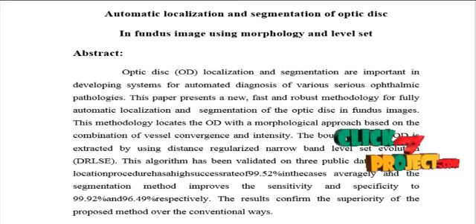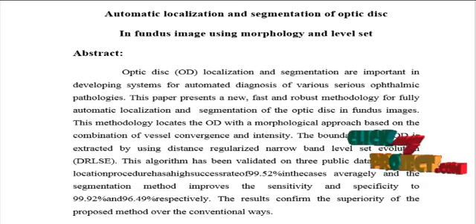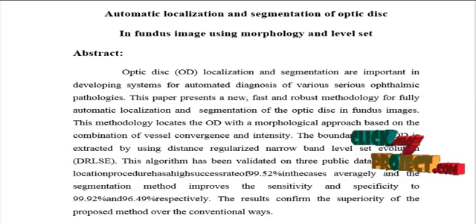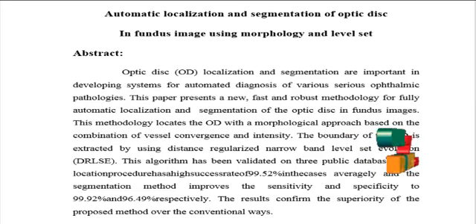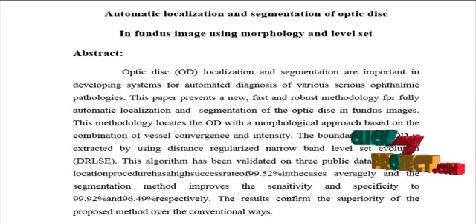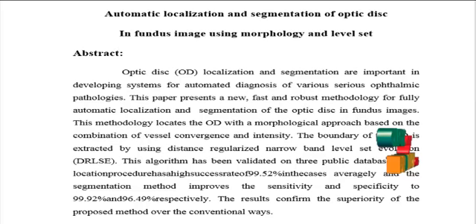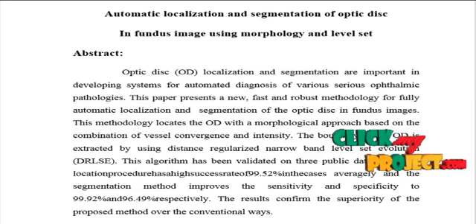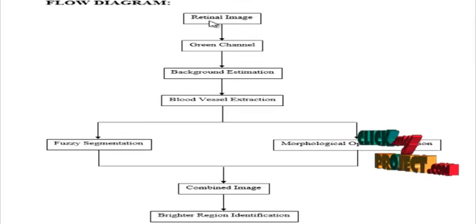Finally, the contours were extracted for the input images based on the level set segmentation process. From the detected regions, the performance of the process is measured in terms of the accuracy, sensitivity, specificity, F measure, area of the processes, and other values that were used as the performance metrics.